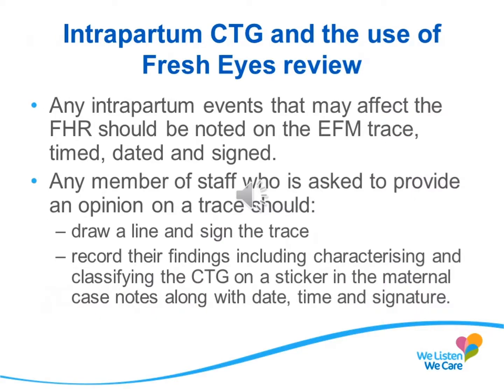During labour, any events that might affect the fetal heart tracing should be noted on the CTG tracing, timed, dated and signed. This could include vaginal examination or epidural, for example. Any member of staff who is asked to provide an opinion on the CTG should draw a line and sign the trace at the point at which they're reviewing it.